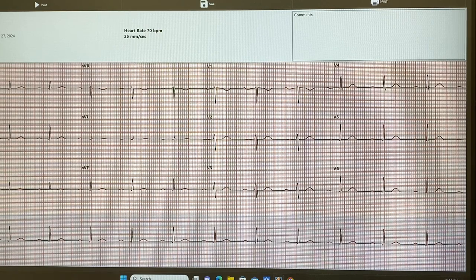Now, what can we say about underlying situations here? That's a good question. Based on what you said last week, there could be some type of sepsis causing a valvular issue. Not with first degree. First degree is actually pretty benign. Nothing like myocarditis? Nope, nothing. The problem is in the AV node. It's just a little sick. Okay, pretty benign.